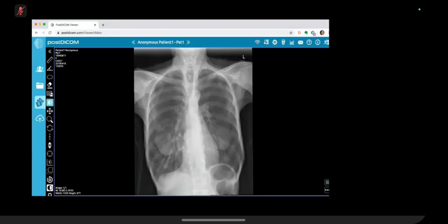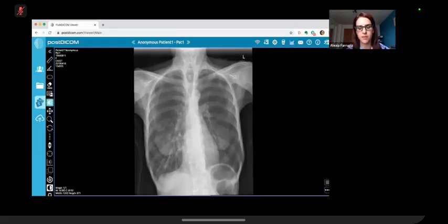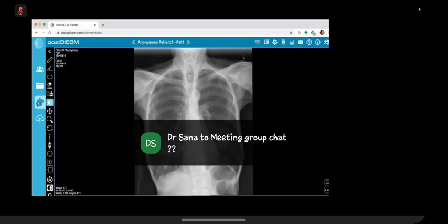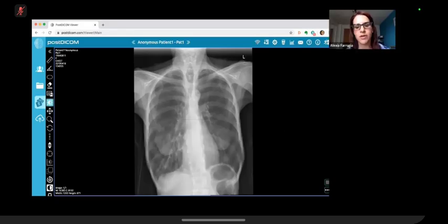Having a look to see if there's any lung nodules or malignancies. I can't see any nodules. There's no pleural effusion, no pneumothorax. The cardiomediastinal contour has a normal appearance. If you focus on the lungs, particularly the right lung, do you see any asymmetry when that's compared to the left lung? Do you notice anything in particular in the lung parenchyma on the right side?